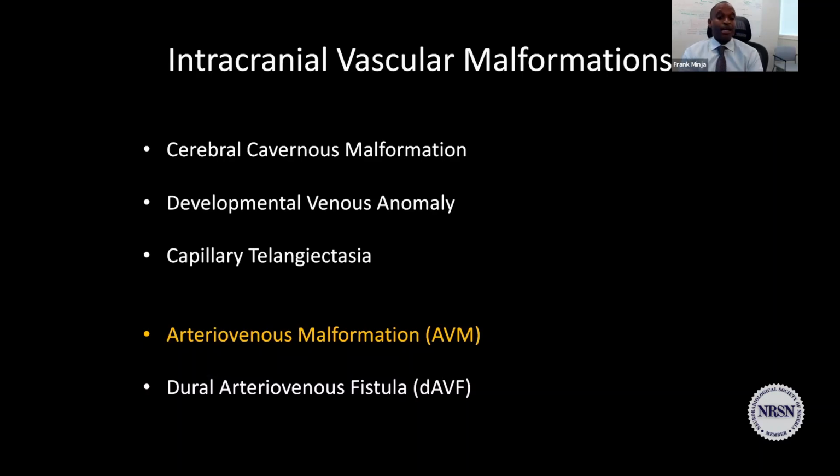Because that now has taken them from the entire other differential diagnosis, whether this could be tumor, whether this could be a sequela of parasitic disease, and other things that can cause enhancement and susceptibility signal artifact. Now, we're going to finish off just by describing the shunt lesions, which is again arteriovenous malformation, AVM, or dural arteriovenous fistula. And I should pause here because this is the big one.